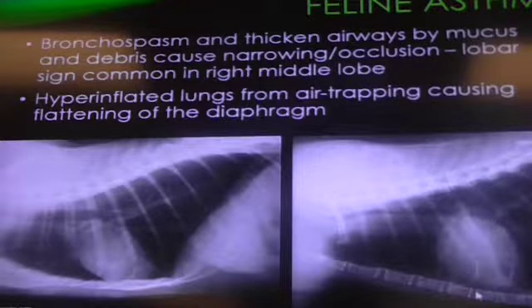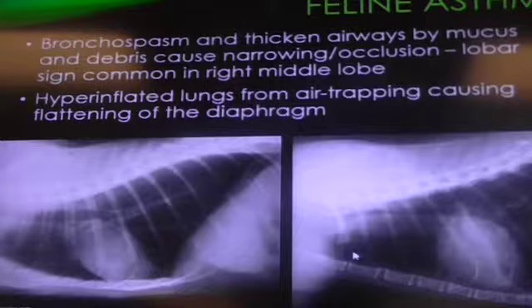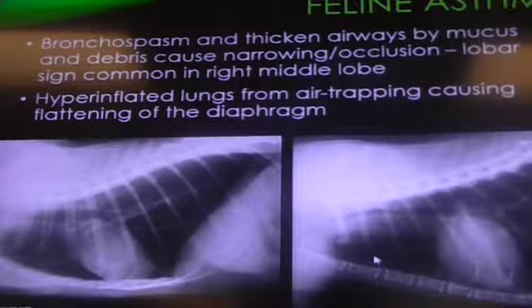Middle? What's the full name of that? Right middle lung lobe. And there is another lung lobe, accessory. What lung lobes are here? Cranial lung lobes. Is it right cranial, left cranial? I'm hearing right or left.